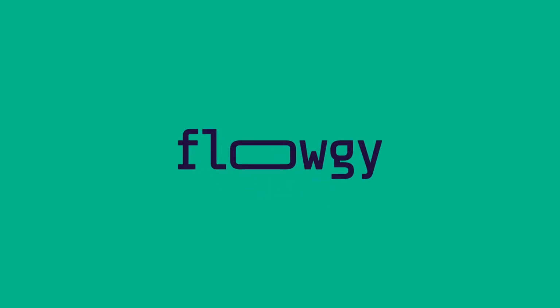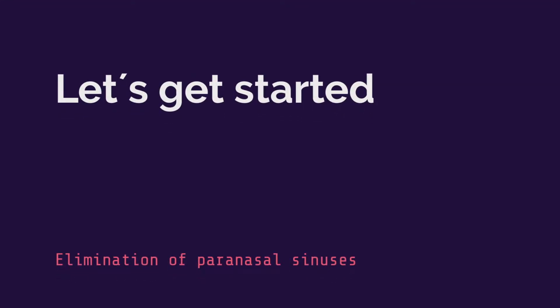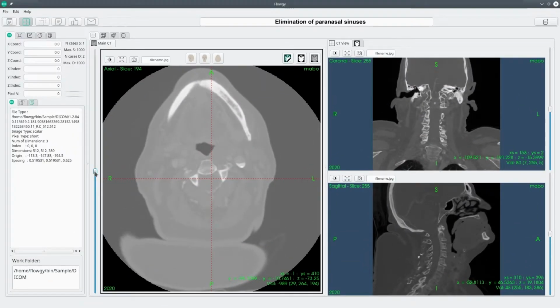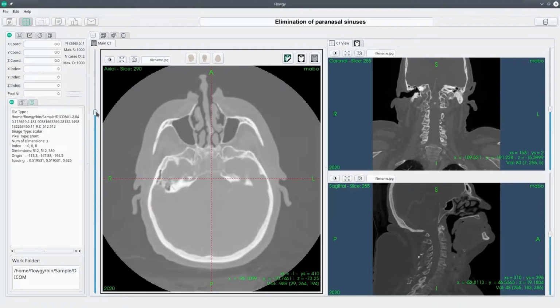Welcome to Flowgy. In this video, we will show how to eliminate paranasal sinuses. Paranasal sinuses are air cavities that are situated on each side of the nose in the upper area, as shown here.